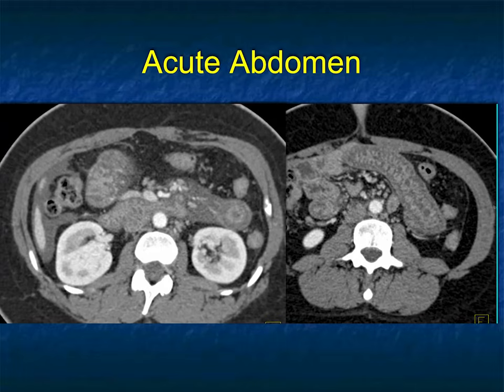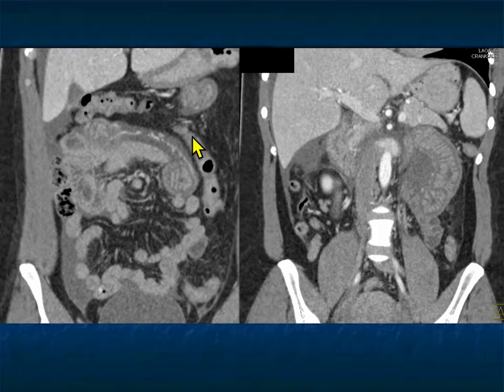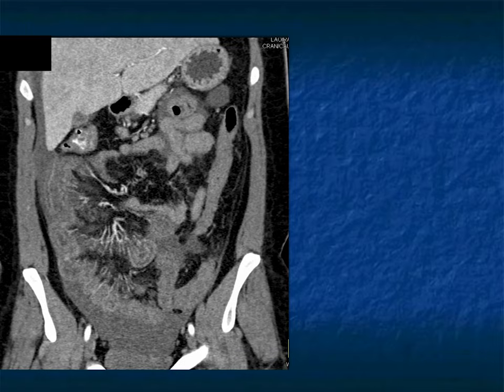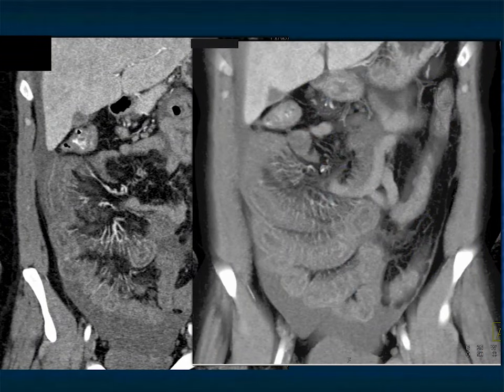Another example, acute abdomen. Look at the patient's duodenum and jejunum. There's also ascites present. Look how extensive the involvement is proximally, but the distal bowel is not involved. I don't see any adhesions. It's all edematous changes. The more you look at the bowel, you realize, yes, there is ascites, and yes, there is edema, but the bowel is markedly edematous.